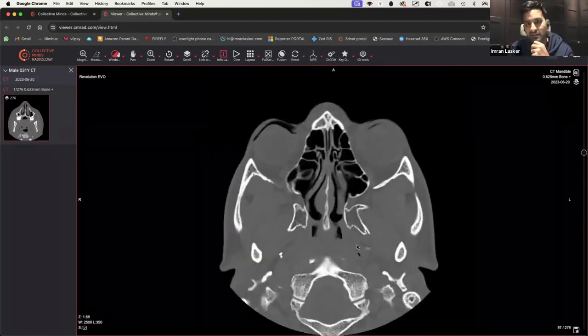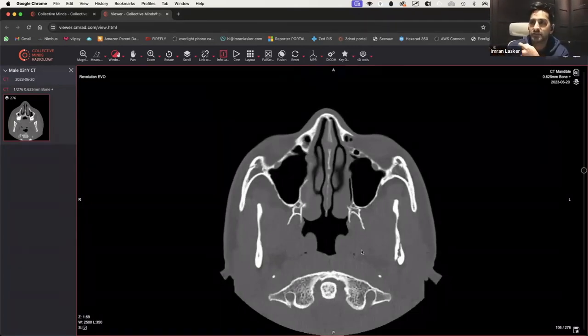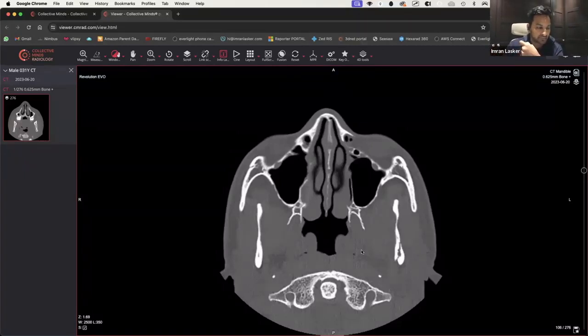Where was that fracture on the? No, it's left. Yeah. So you know that common thing that they say, if you're going to sustain injury getting punched, usually it's the left side, because the person punching you is going to be right-handed. Oh yeah, you know the 3D. I'll come back to the 3D recon thing because I've done exactly the same thing. So normally it's going to be the left side of the face that gets injured because most people who are going to punch you are going to be right-handed.